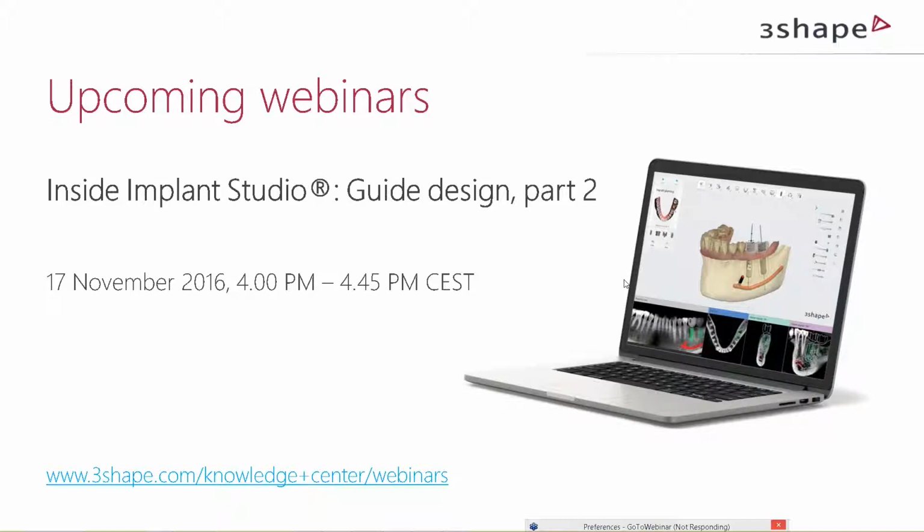I can see that more people are asking about multi-unit abutments. So far, as far as I know, it's the Biodental library that is offered as multi-unit. So you can check those, and maybe contact them directly to get those enabled.